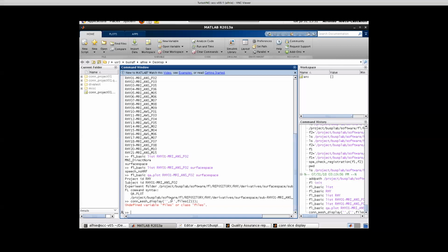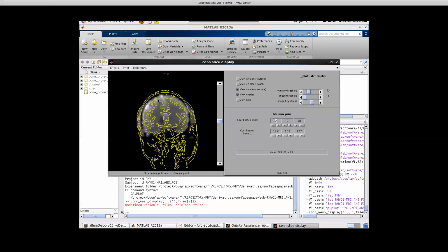And I think what Alfonso was explaining before is projecting the outline of the FreeSurfer surface onto the functional volume, just to see whether those are aligned. Right. I think having these yellow lines being FreeSurfer generated surfaces might be useful to identify potential problems. And whether we want to actually have the anatomical or the functional data as the background, I'm not totally sure what might be most useful. Probably the functional, because that's ultimately where we are going to be extracting data from. And that would allow us to also identify problems in the correlation, but perhaps we are mixing two things.